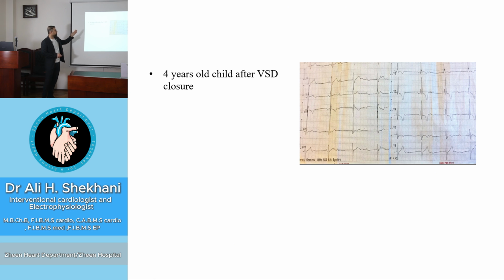We have a 4-year-old child after VSD closure. This bradycardia, there is P wave, but there is no relation between P and QRS. There is AV dissociation, so it is complete heart block post-VSD closure.